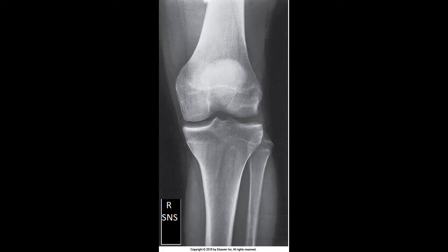You can see the entire knee without any evidence of rotation. As I said, the femoral condyles are symmetric, and the tibia intercondylar eminence is centered. There is the normal slight superimposition of the fibular head. Her tibia was just fine.